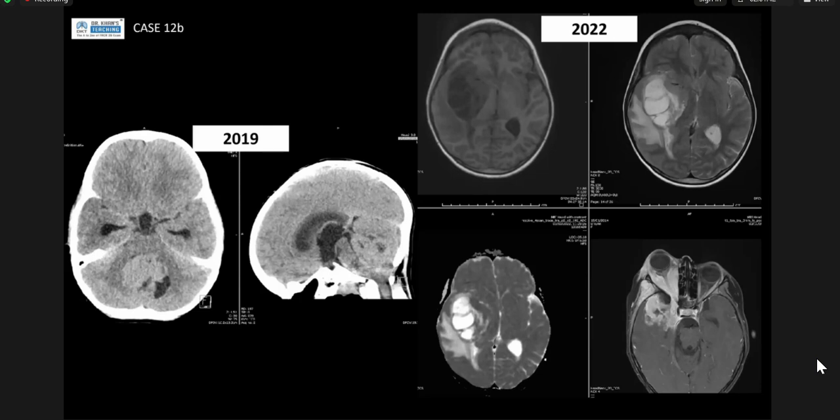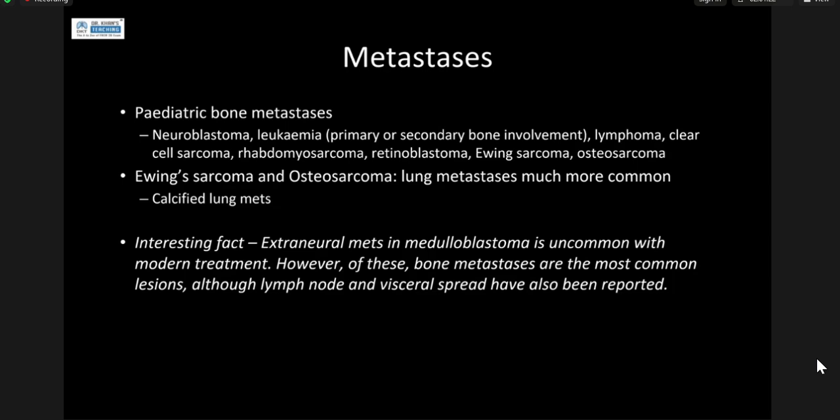Is it a lymphoma? So the parietal bone lesion appears. If it had been an adult, I would have said, with the temporoparietal lesion, I would have said it to be a glioblastoma. So I think that this is a really nice case. Actually, Sam knows this case better than I do.